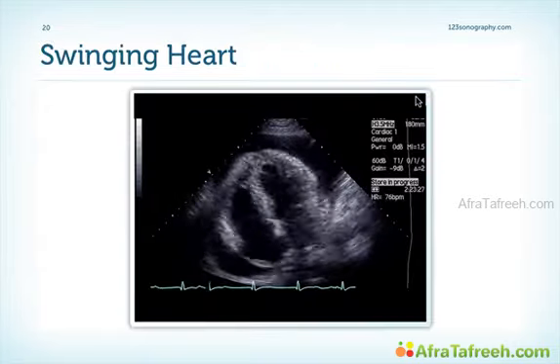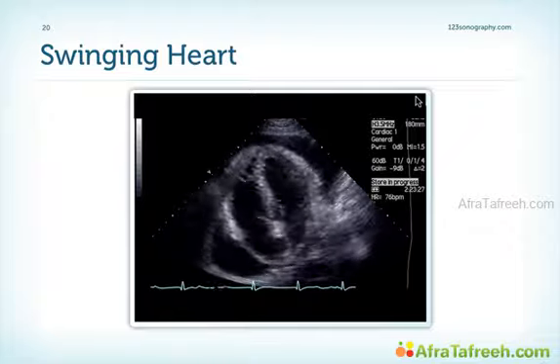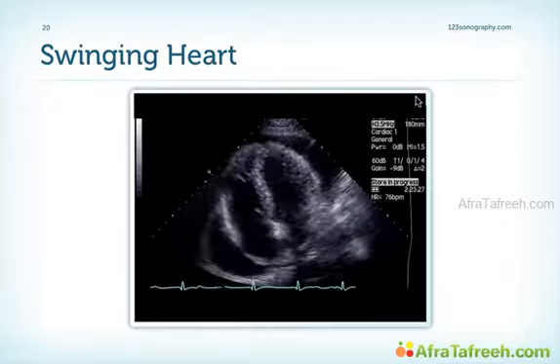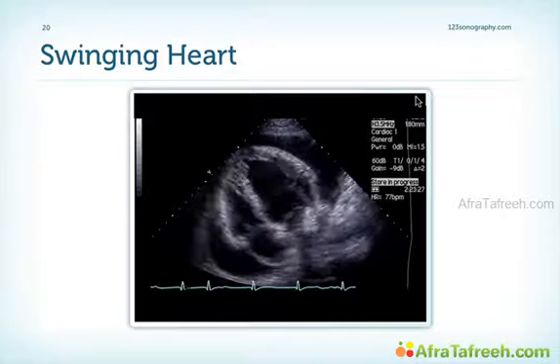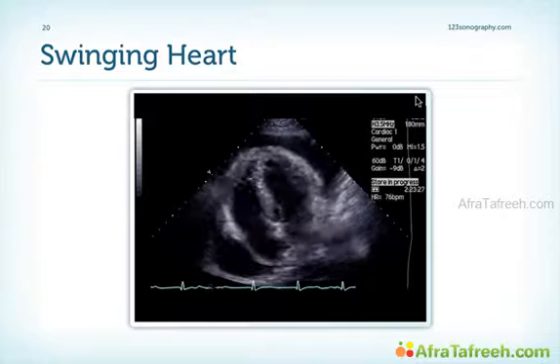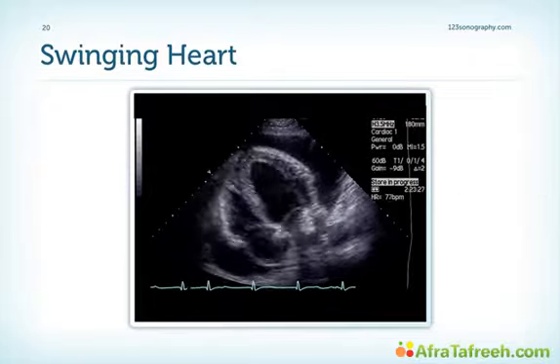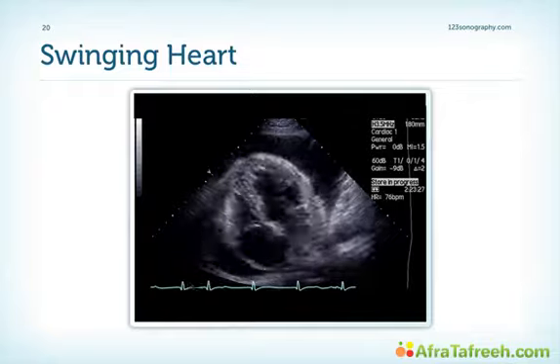This is such a patient who had lung cancer and who developed a very large pericardial effusion with a swinging heart. This patient was symptomatic and pericardial drainage had to be performed. Nevertheless, the patient died only 6 weeks later. But can we directly visualize carcinosis of the pericardium? Well, unfortunately not. It is always an indirect diagnosis.